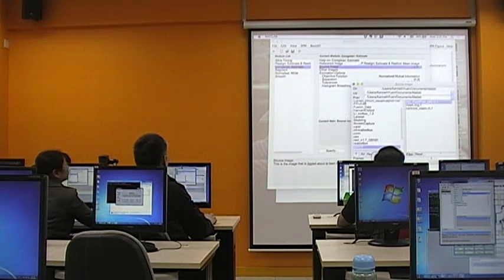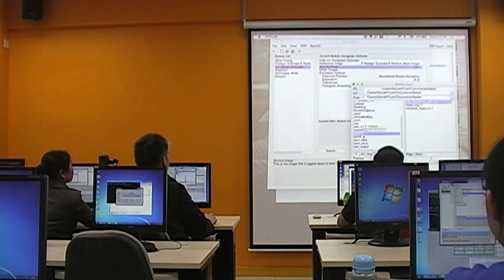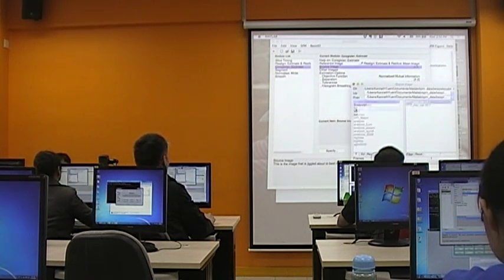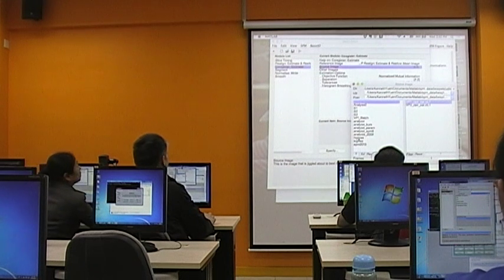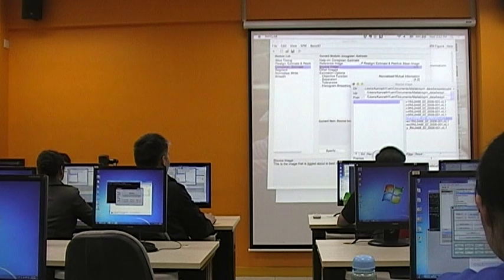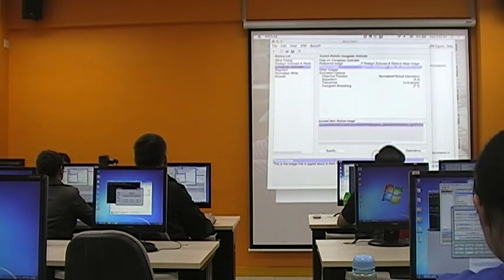So I just go up one level and then SPM data, yes. And here when you go to BP1 and you click high res, and I'll put in the raw file, fn, here, okay?